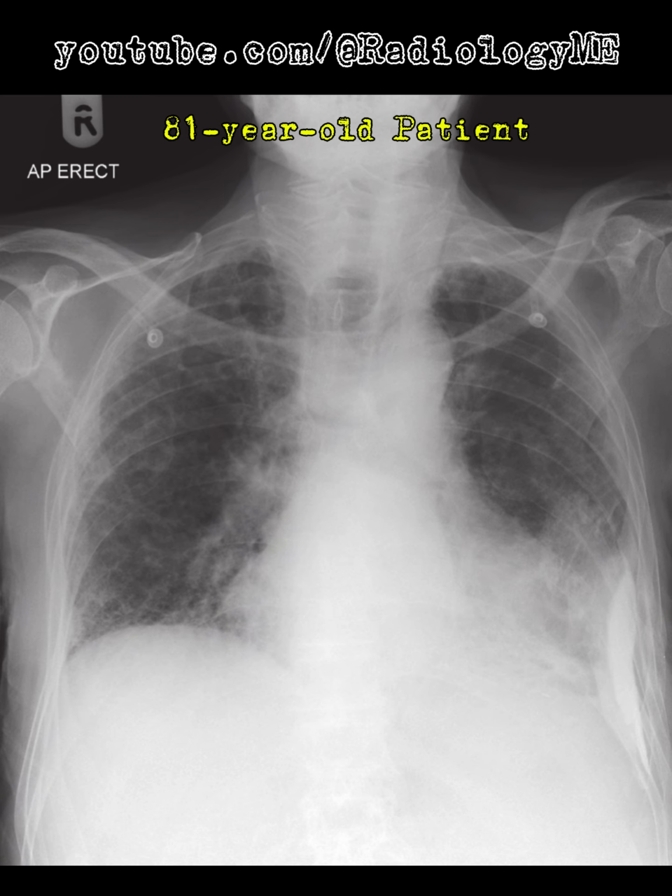When I consider the entire picture, it's pretty clear that this patient, who is 81 years old, is dealing with pulmonary asbestosis. The calcified pleural plaques, combined with the basal fibrosis, are very telling. Now, just a quick reminder, the plaques themselves don't necessarily mean asbestosis on their own, but when you pair them with this pattern of fibrosis, it's a strong case for it.